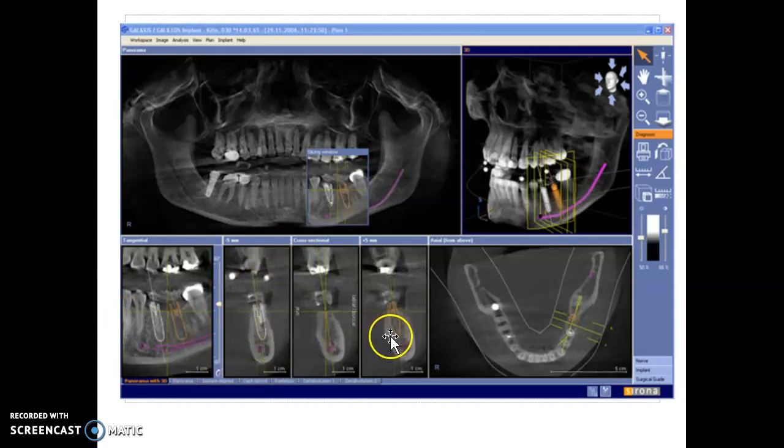So you've got 1, 2, 3 little images here. Those 1, 2, 3 images are images 1, 2, and 3. Or you can look at it in this horizontal slice, 1, 2, and 3. What you're able to do, this just gives you fewer vertical slices, but it doesn't matter. You're looking at that one area.